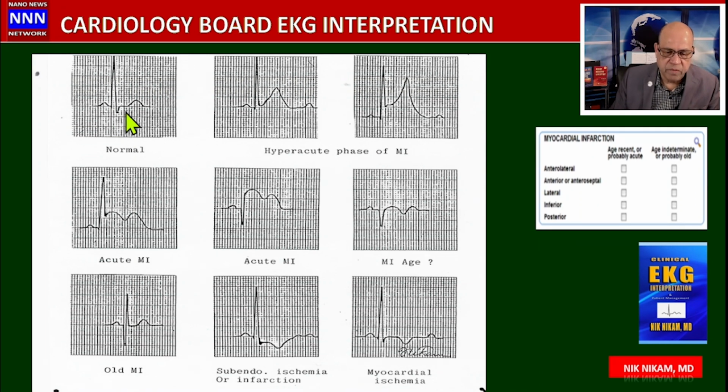image of this one. In case of an acute myocardial infarction, let's talk about an acute occlusion of a branch of a coronary artery. The first thing that we will notice is the straightening of the ST segment, which is rarely ever talked about.